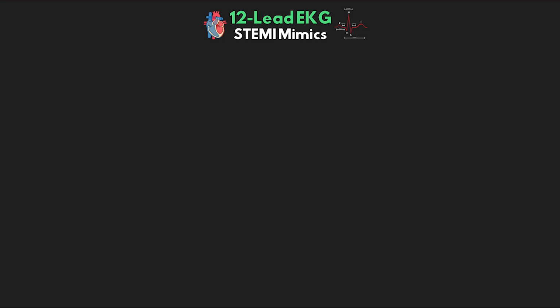Therefore, when we see ST elevation on our patient's EKG, we often react quickly to this. We also need to ensure that this is a true STEMI that we're seeing. Again, when in doubt, treat it as such, but there are a group of conditions that can produce ST elevation on EKG that are not the result of an infarction. Some of them still do require emergent or urgent intervention, but then there are some that don't require anything and actually are quote-unquote normal for our patient. We call this group of conditions our STEMI mimics because they do just that. So that's exactly what we're going to talk about in this lesson here.